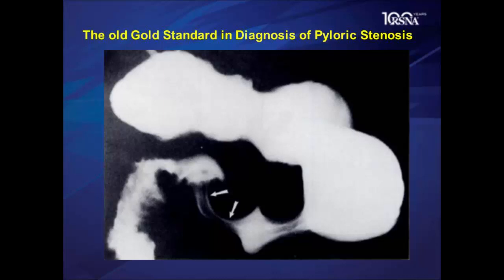But when it comes to imaging, we have the shoulder sign, secondary to the hypertrophy of the pyloric muscle. There will be delayed passage of contrast, and then we would have a train track sign, and then we get an umbrella sign of duodenum following that elongated channel.